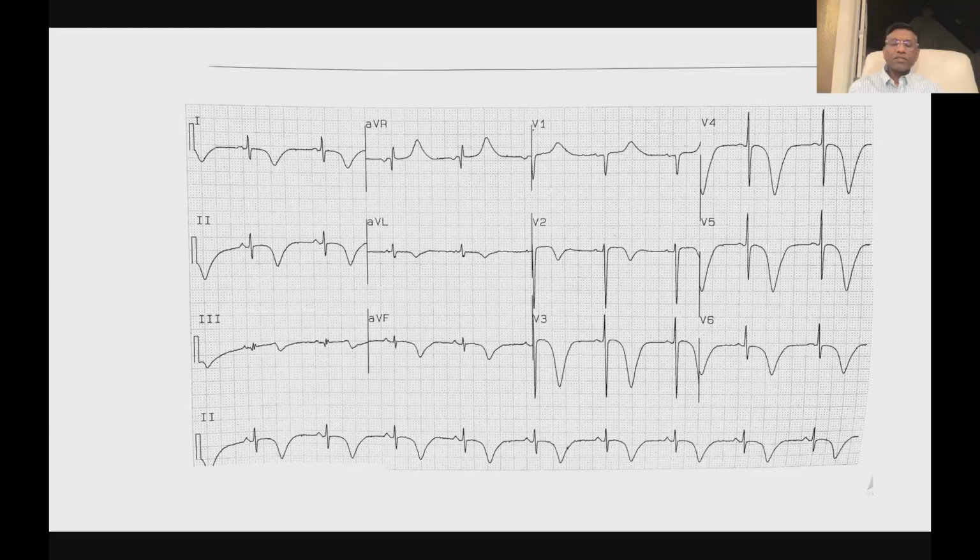So I think this was not one that I wanted to dissect very deeply, but I just wanted to give you a tracing like this and say, what are you suspicious of if you're handed this EKG? What is a clinical diagnosis that might cross your mind when you see this? Obviously we're looking at giant T-wave inversion, right? It's an enormous T-wave.